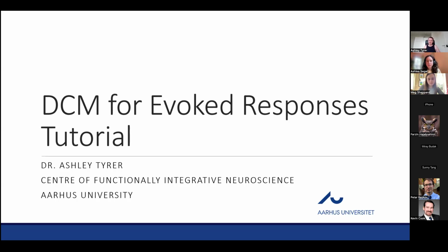Like you said, my name is also Ashley. I'm a postdoc at the Embodied Computation Group at the Centre of Functionally Integrative Neuroscience at Aarhus University in Denmark. And today I'll be giving you a tutorial about how to run dynamic causal modelling for evoked responses using the SPM12 toolbox.